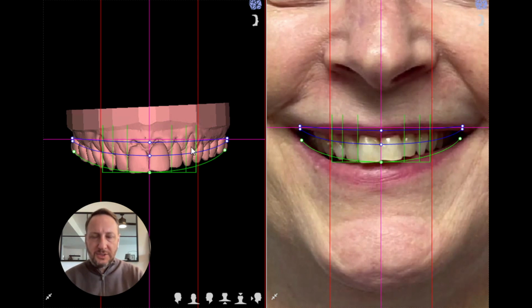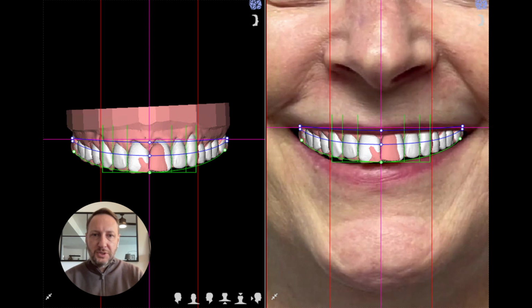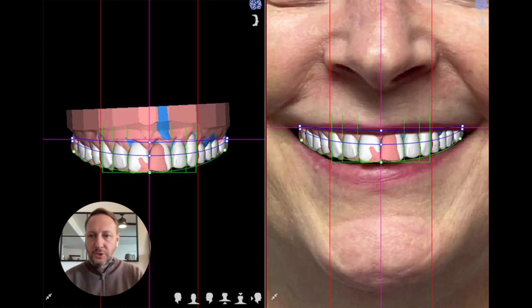then the gingival margins, the midline of the face, the proportion. And with these lines in mind, we can start placing our design, okay? So we can actually visualize this on the patient's face, okay? So here we can export these images to the patient's face, and with the positioning of the design, we can first do what we call a virtual mock-up.